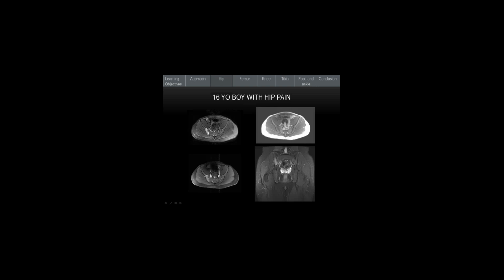So sacroiliitis, we'll often lump it in with hip pain, although anatomically it's in a different region. We can detect sacroiliitis with the experienced clinician from physical examination and from radiographs, but the most sensitive imaging modality is certainly MRI. In the US, we have a lot of MRI, which is good and bad. In this case, it's good that we can diagnose these types of findings with imaging, which is readily available. On the other hand, sometimes it hurts the clinical skills of clinicians who are more prone to just ordering imaging than to be able to practice their physical examination skills.